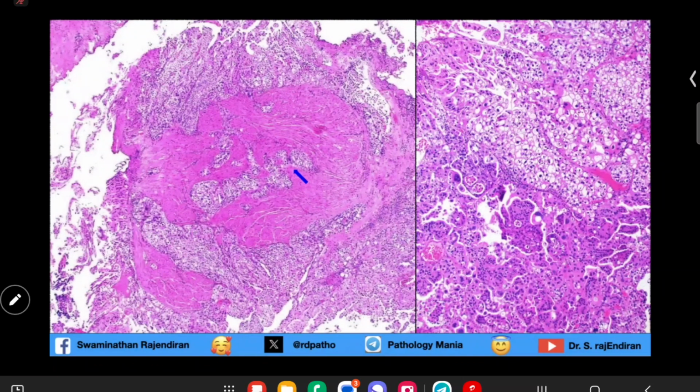It's a papillary urothelial carcinoma, high grade. Muscle bundles are not seen in this biopsy. And this is again invasion. Here it is the traditional urothelial carcinoma, whereas here you can see clear cell urothelial carcinoma, which we will be seeing in a minute.